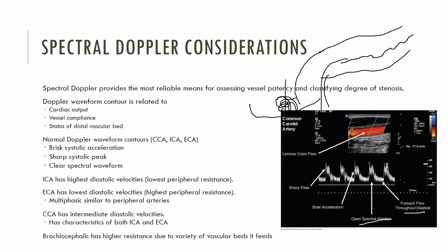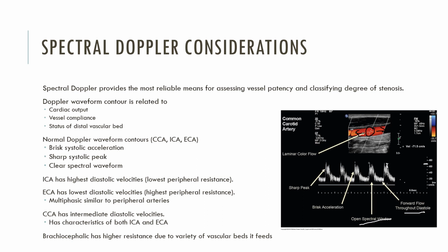So same kind of idea with our blood. When we're looking at our spectral Doppler, while we're gaining information from this one tiny region, that's not all we're gaining. We're gaining indicators of what's happening upstream and what's happening downstream. So what we've been through and where we're going. And so we always want to be taking those two things into consideration as you're seeing these waveforms pop up.